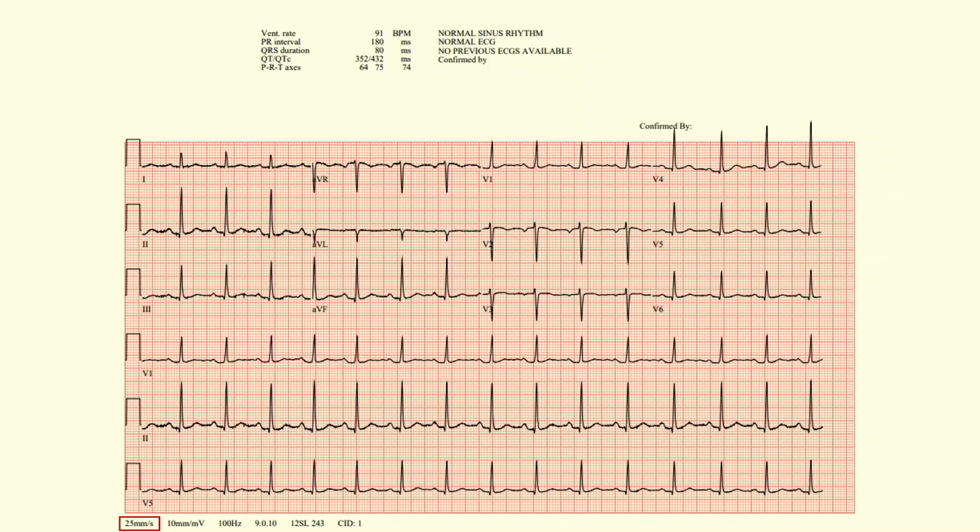But a standard 12-lead ECG in the United States is 25 millimeters per second. On the machine, you can actually change this, which I do sometimes. If I'm really trying to figure out if it might be like a subtle 2-to-1 flutter and I want to increase my resolution on the x-axis, on the 12-lead machine, you can actually change to 50 millimeters per second. But one box wide tells you that it's 25, and then the height of that, two boxes, that's kind of like the volume knob of the ECG. It's called the gain. So standard gain is 10 millimeters per millivolt, but if the patient has amyloid and they have really low amplitude stuff and you want to see it, you can increase that on the machine. And if it's really high, all the waveforms are overlapped, left ventricular hypertrophy, you can crank that down a little bit.